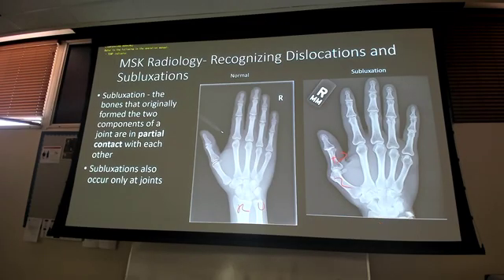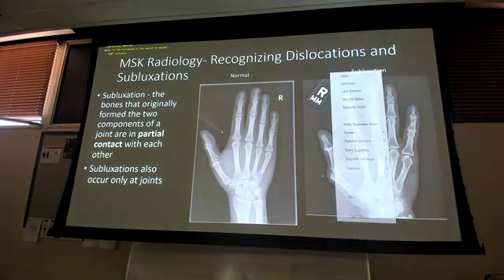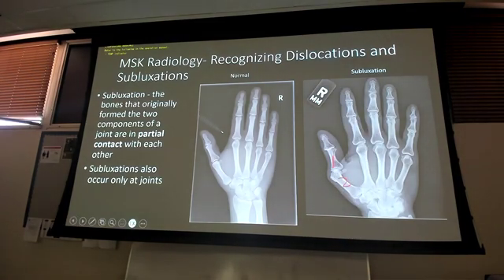So, first, our subluxation is there. I have two fragments of my subluxation, 1 and 2. 1 is my distal fragment. Because it's distal, I want to know what direction that fragment is going, and that's how I'm going to name it.